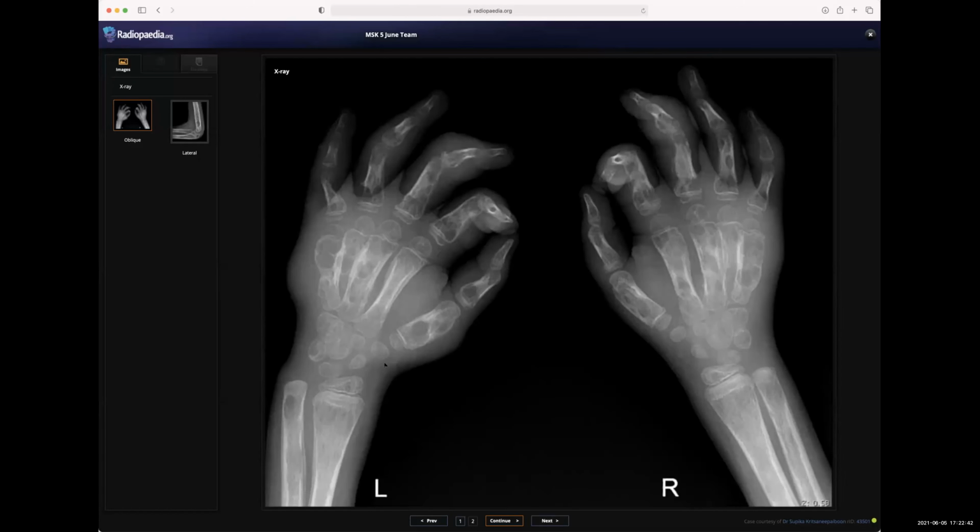So in this child, it is very unlikely that this child has a lung neoplastic lesion. What else can it be? Looking at this, it's a picture of hypertrophic osteoarthropathy with these multiple lucent lesions. I'm trying to classify them into one disease, but at the moment, Caffey's disease would not cause these lesions. Really, I'm at a loss here, Dr. Laila, and the time is also up.